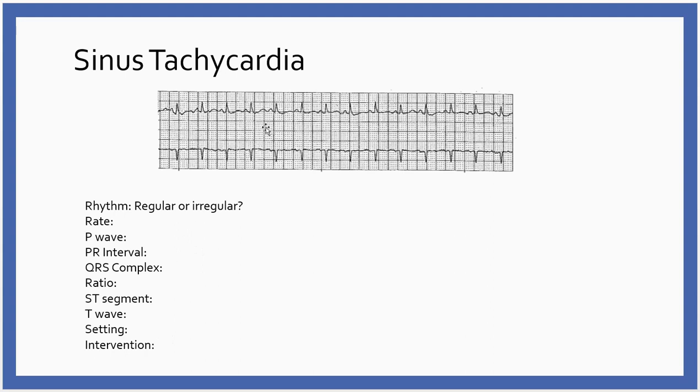I'm looking at my T wave now, and my T wave is here. Hard to see, this is movement. It's upright. It's not very roundy. Now what I want to do is find the T wave that's easiest to see when I do my QT interval. Let's see. This one looks pretty neat because I can see my P wave, my QRS, little ST segment depression. Here's my T wave. I'm going to measure my QT interval from the beginning of the QRS to the end of the T wave.